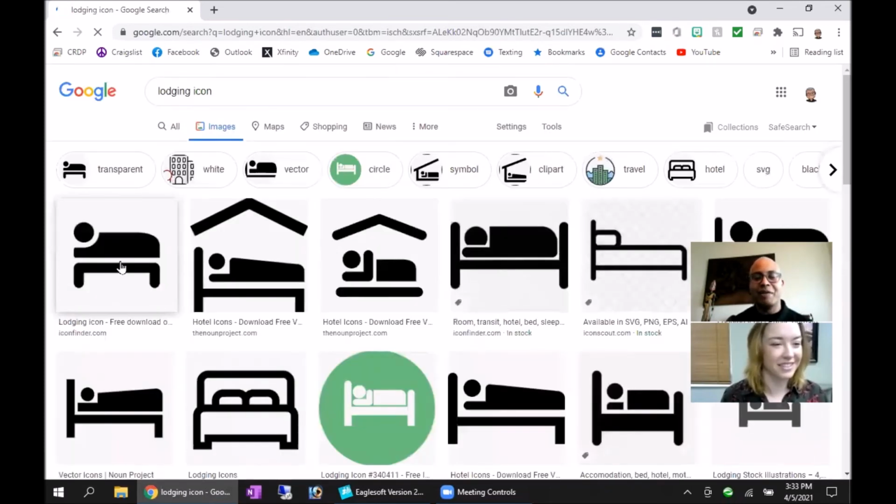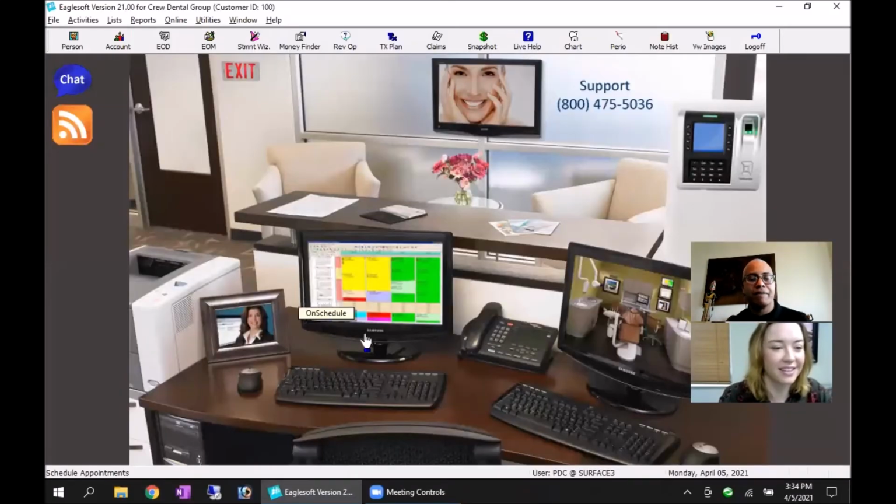So I just take that image and use Microsoft Paint to make the background red, yellow, and green, and save that as my icon. And it just has to be 32 pixels by 32 pixels, and it has to be a bitmap format. But you can make anything into an icon. It always works best if you look for an icon, because once you start making them smaller, they lose the detail. But that's how I make those icons.